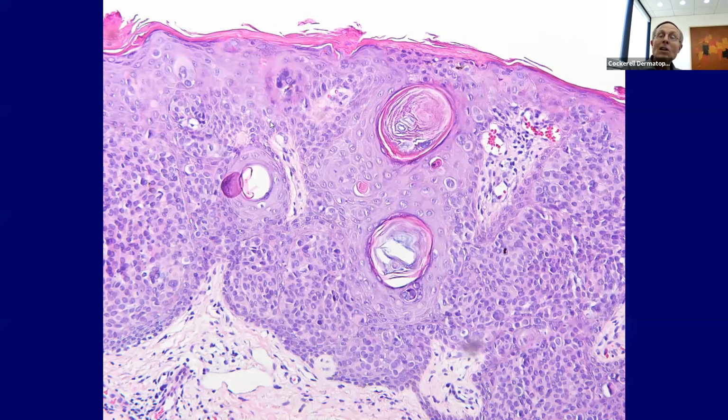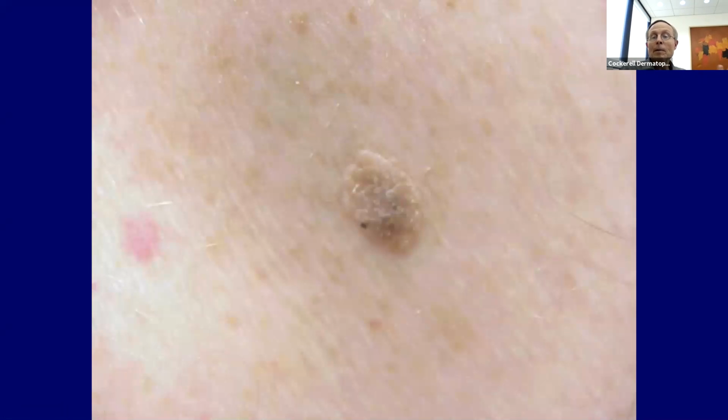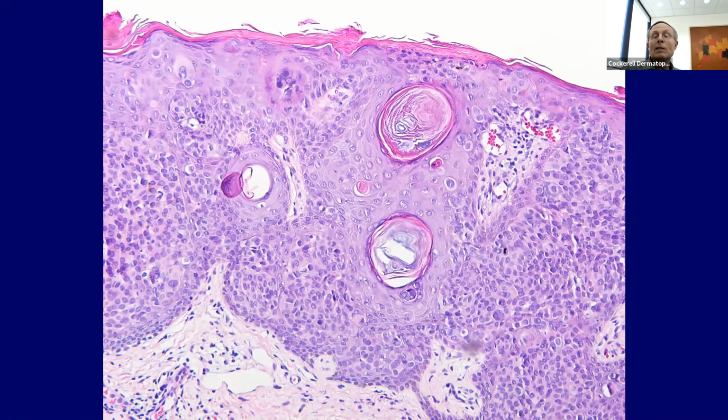But here you've got a classic area of seborrheic keratosis with these little clonal areas. So yeah, somebody wrote clonal SK. Clinically, there's no way to tell these apart from other SKs. It's just histologically, it's an interesting finding, and it's a benign process that can simulate malignancy. So you might encounter this on the exam. It's possible, a little bit esoteric, but they might put it on here.